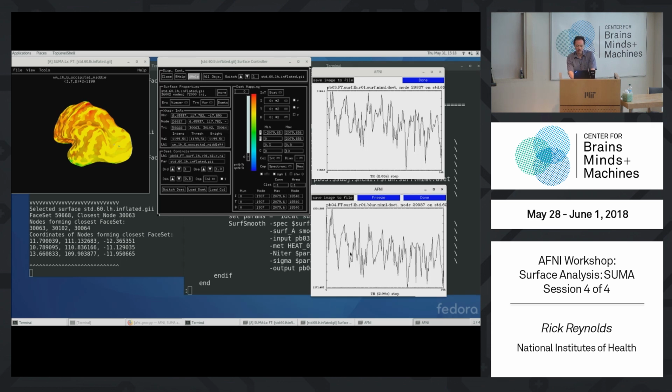So now it's blurred. And you notice, to some degree, if you look at these first couple of humps here, they look better. They look smoother. So the blurring operation, in this case, looks like it kept the signal more or less as it is, but it reduced the error. The error blurs towards 0, as we might hope. So we would hope that the blur operation does a better cleaning job on the signal in the surface domain as opposed to the volume domain.